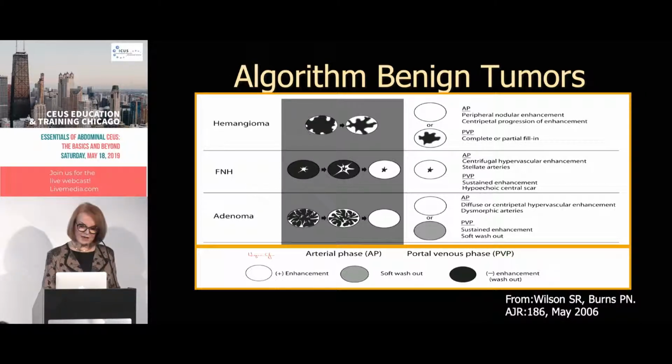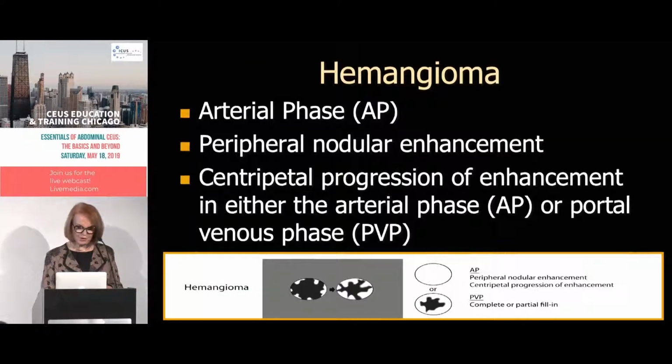They stay sustained enhancement. And of course, the adenoma, if you remember something from this talk, you want to remember that adenoma is the exception to all the rules. So we'll show that as we go along. So let's talk about hemangioma first.